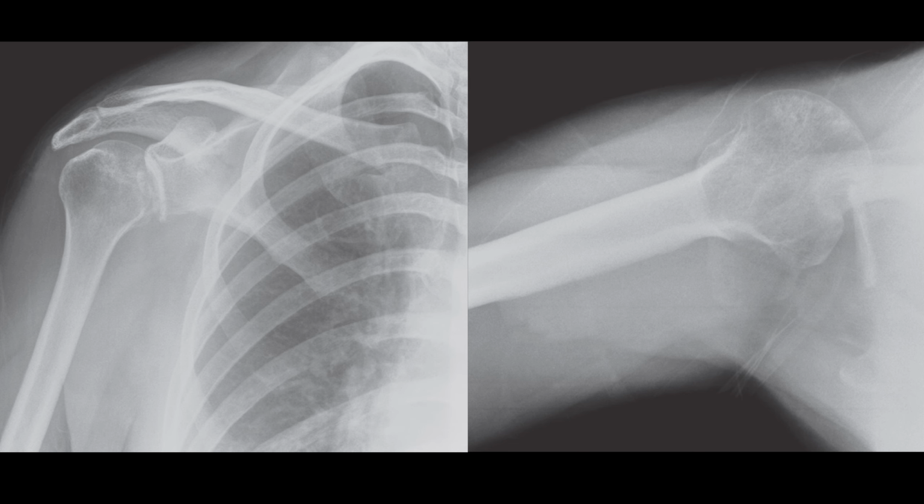Now, discussing shoulder trauma more broadly, the type of radiographic view is crucial for identifying dislocations. Dislocations can be hard to detect on an antero-posterior view alone. It's important to ensure that the curved articular surfaces of the glenoid fossa and the humeral head are congruent. If the humeral head appears magnified or minified relative to the glenoid, it may indicate dislocation depending on the direction of the beam and the dislocation itself.